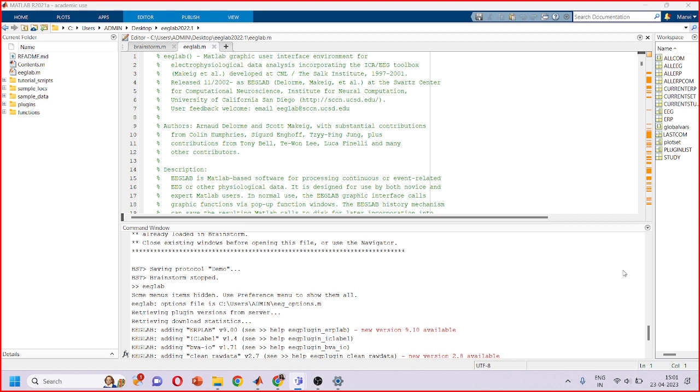I'll start with EEGLab. I'll open it up and we can just get the data pre-processed here. In case anybody has a question, or thinks that we should move on to something else like frequency analysis, you're free to put it in the chat box. And in case I'm not able to look at the chat box, please feel free to open your mic and speak up.